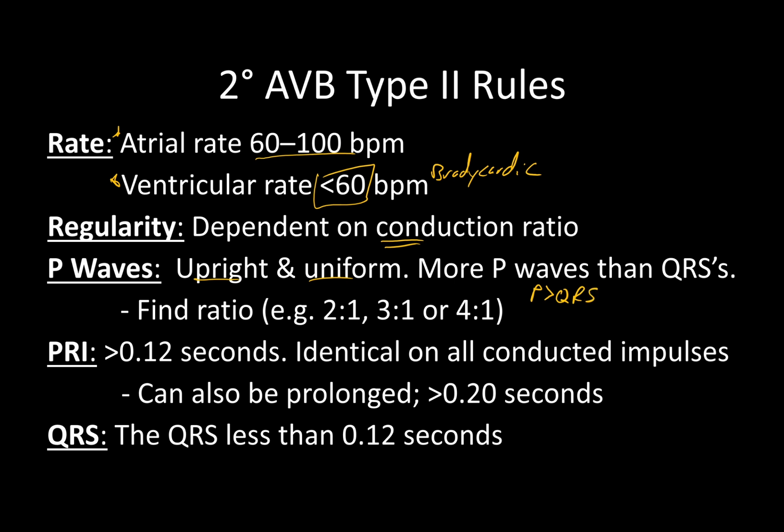And if you have a regular pattern, it's really beneficial if you can figure out what your ratios are. It's like, is there 4 P waves for every QRS? Or is it 3 P waves for every QRS? And that's what we're talking about, is P to QRS ratios.